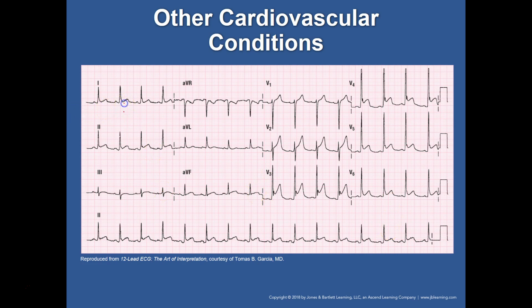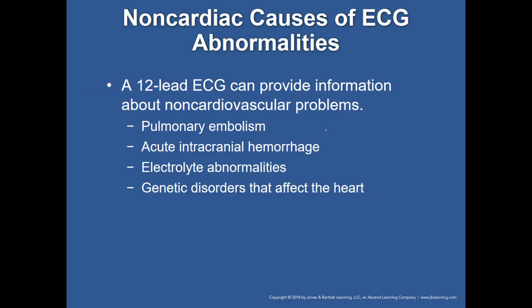So we see it here. We see it here. We've got leads 1 and 2. Looks like we've got some here, here. We're seeing it all over the place, so kind of just that global view. When we look at all of these put together as one, nearly all of them have some ST segment elevation. So we would expect that the entire heart, that all of the coronary arteries, did not get blocked all at the same time.